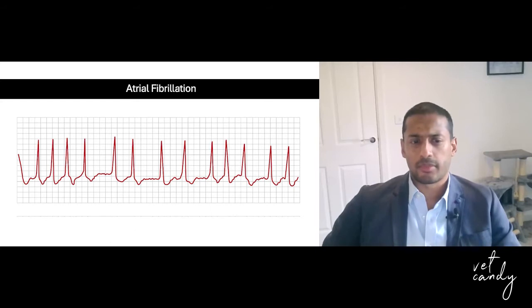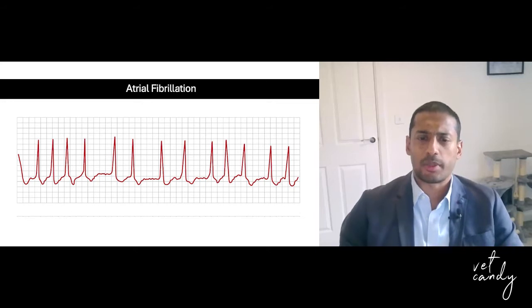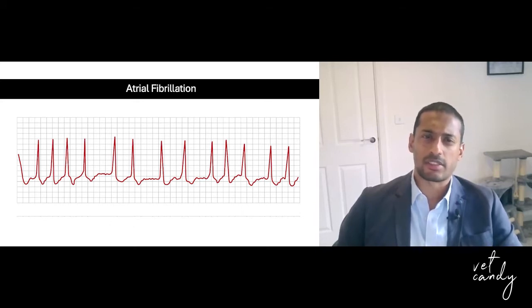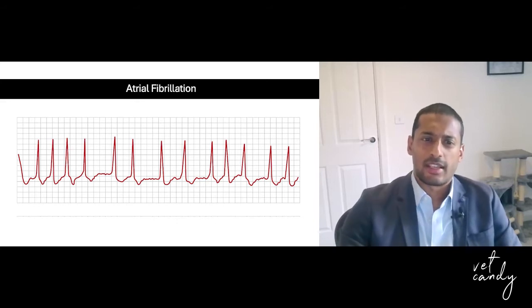In atrial fibrillation, rather than atrial depolarization being controlled by the sinoatrial node, there is constant random activity throughout the atria, which causes intermittent and variable AV node conduction and ventricular depolarization. Patients with atrial fibrillation have a pretty typical auscultation. The heart rate is totally irregular, often pretty fast, and there are pulse deficits. The faster the rate, the more variable the pulse quality, and the greater the discrepancy is between heart rate and pulse rate. The ECG in atrial fibrillation has a characteristic appearance with three important findings.